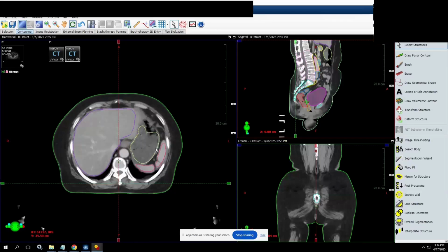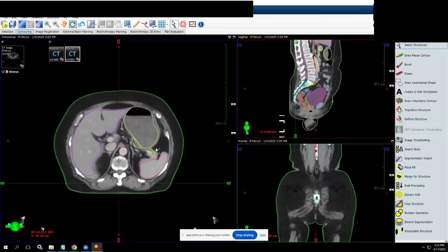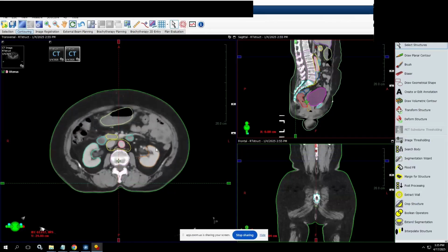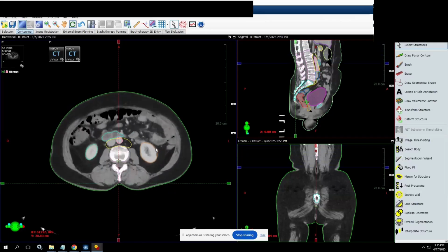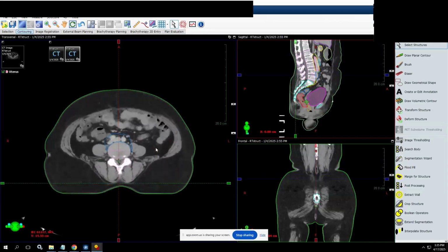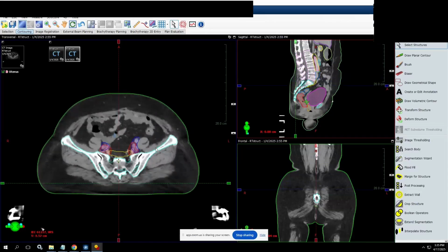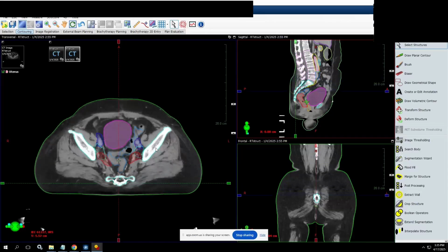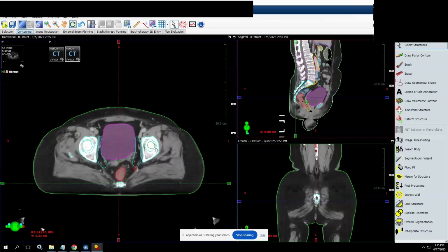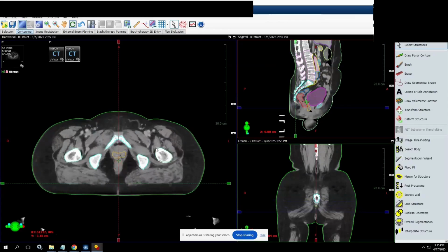This is the segmentation of gynae cases. Now this model was quite interesting because we only did this training with a very small number of cases. And you can see that the performance in terms of segmentation of the para-aortic nodal region, kidneys, abdominal organs, etc. are quite reasonable. Here we are highlighting the possibility of nodal substructure solutions, and here external iliac, internal iliac, and obturator nodal volumes have been separately drawn.